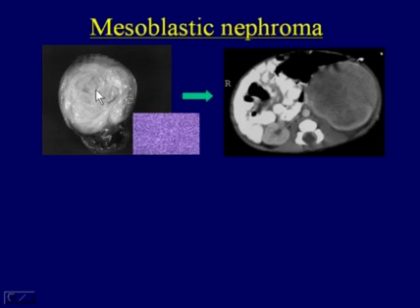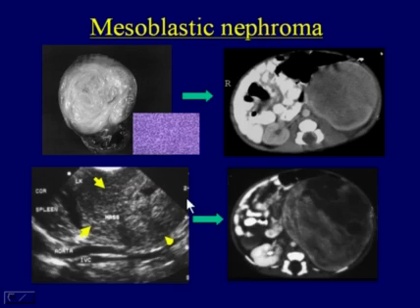They almost have a muscle tumor look with a histology that has multiple spindle cells. It almost looks leiomyomatous in some ways. Not very vascular, and as you can imagine by CT, they also have a very featureless looking appearance, and they can be quite variable in size, sometimes being quite large.